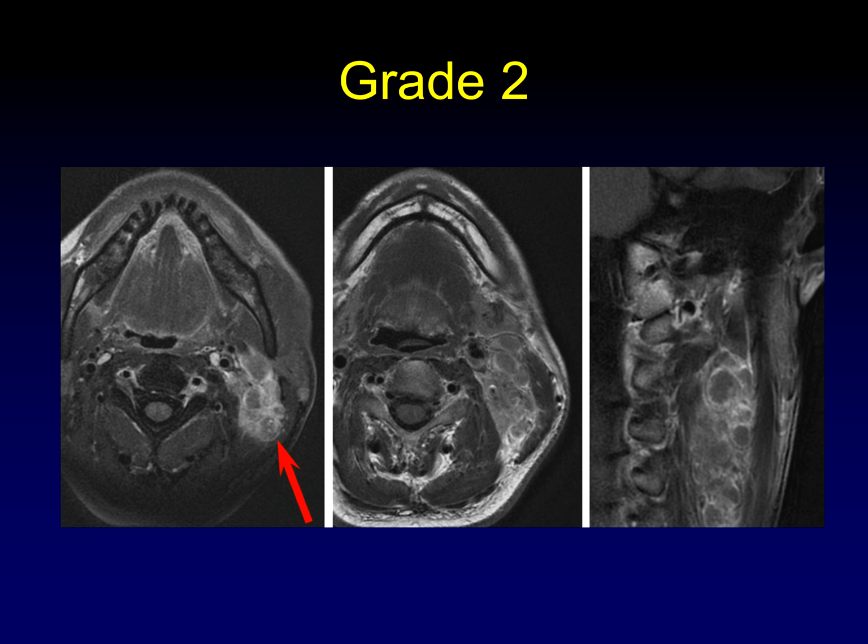Sometimes there's just a ton of nodes all clustered together, and there is no doubt that these are all confluent with one another, coalescent into one another. There's just 50, 60 nodes here, and it's obvious.